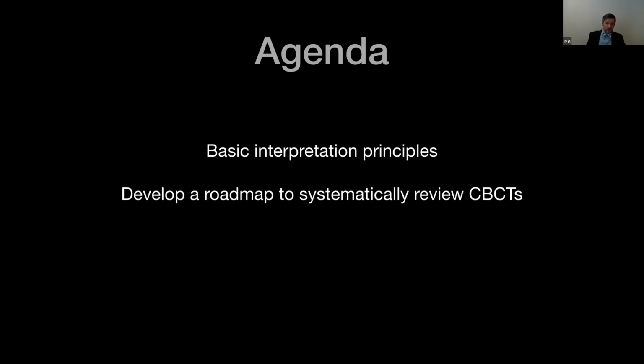Some tips to keep in mind when interpreting CBCTs to hopefully make it easier to review. Go over an example of workflow for how to review your cone beams. So really for the new owners, helping you develop a workflow for how to systematically review your scans. And so we'll get into what I mean when I refer to systematic review of cases.